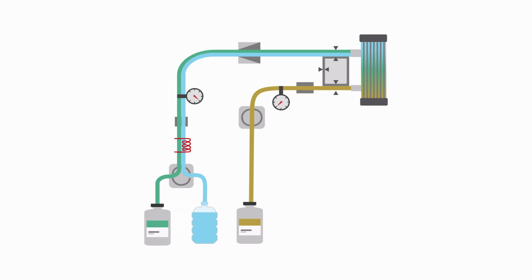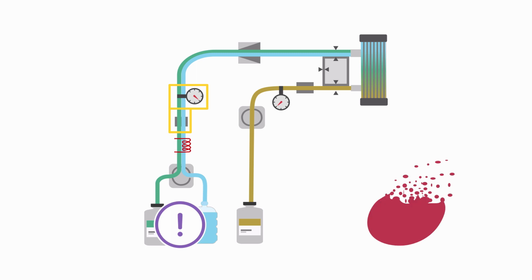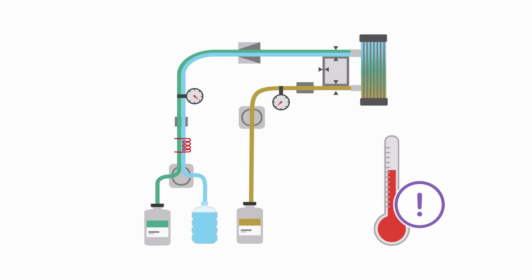There are several monitors and alarms in the dialysate circuit for temperature and electrical conductivity. If the proportioning system excessively dilutes or concentrates the dialysis solution, it can lead to electrolyte disturbances and/or hemolysis. The concentration of the dialysis solution will be reflected by its electrical conductivity. If either the dialysis solution conductivity or temperature is found to be out of limits, a bypass valve is activated to divert the dialysis solution around the dialyzer directly to the drain and not to the patient.